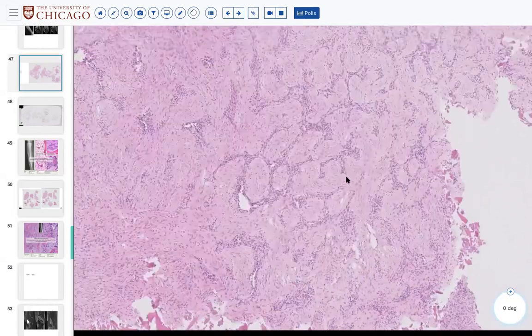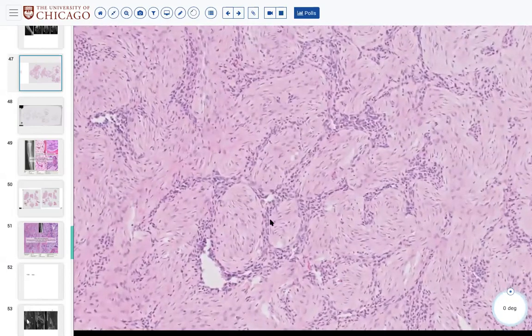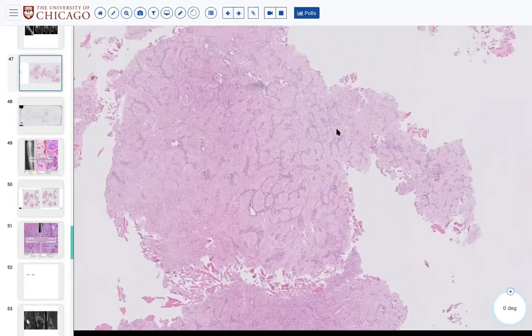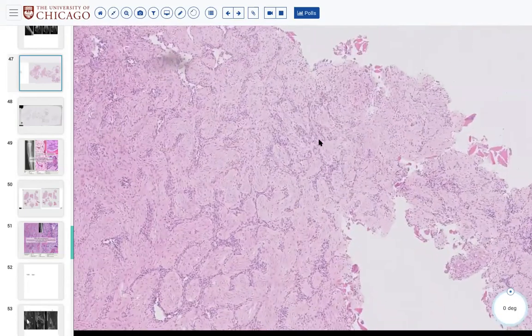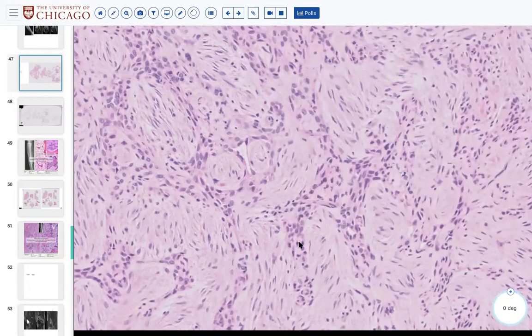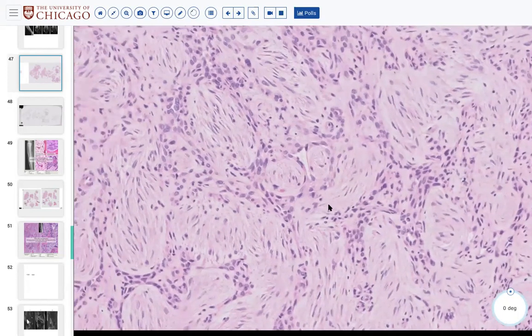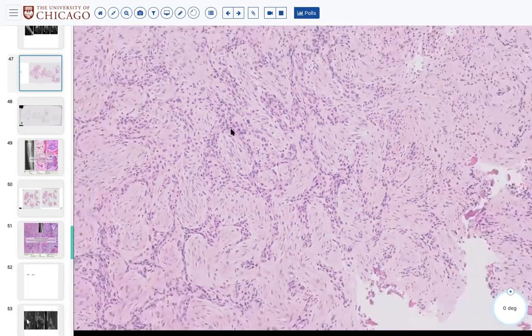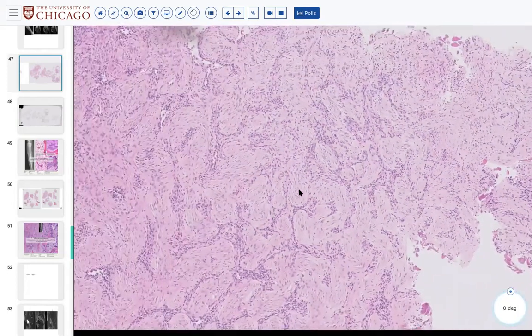Somebody told me that they saw these islands here. Thank you, Jasmine. What do you think those stellate islands are? Osteoblasts, or I don't know, or related to blood vessels. Epithelium. Jasmine says epithelium. I was almost thinking like an adamantinoma kind of look.